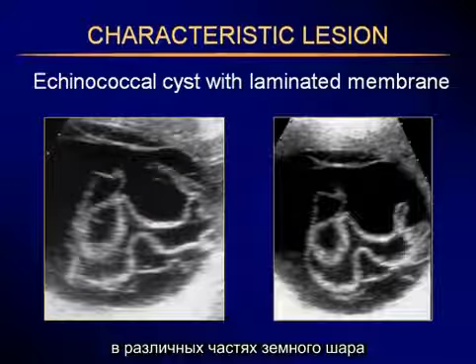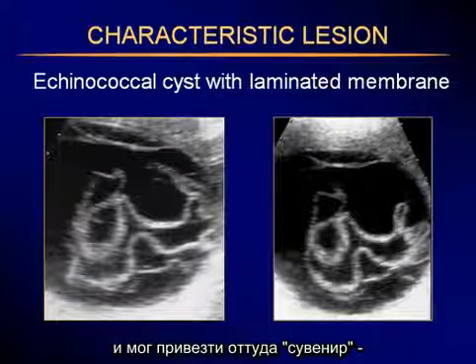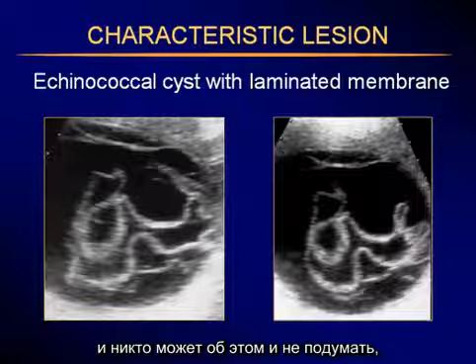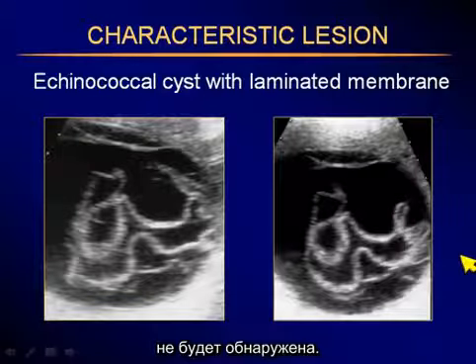Patients travel these days to various parts of the world and may bring back a souvenir, an echinococcal cyst, and nobody may think of it until the characteristic sonographic picture is presented.